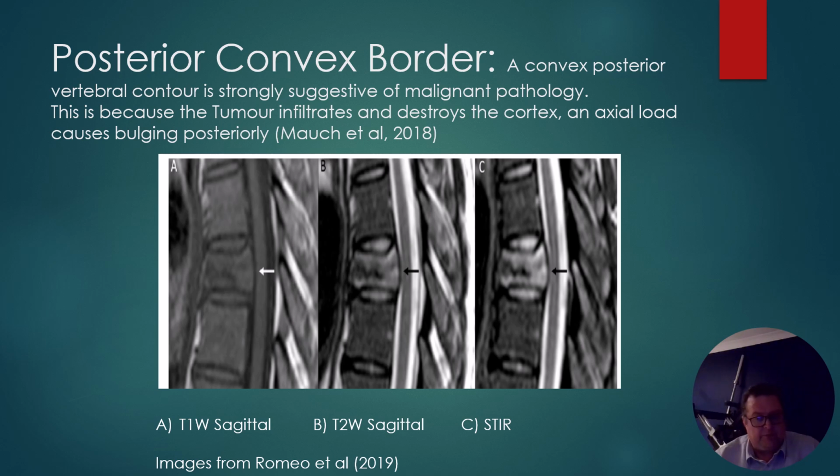If, however, the patient's posterior element, the pedicles, are normal, there is no convex border, there's no sign of soft tissue mass, there is some sparing of some of the marrow, and there is that low intensity band on T1-2 parallel to the end plates, then these are all suggestive of it not being malignant, but being because of osteoporosis.